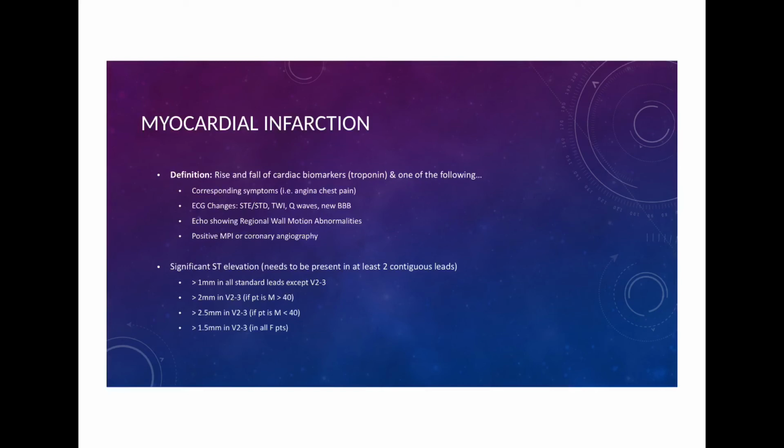Moving on to recognizing patterns of myocardial infarction. This is another common reason that we get ECGs in our patients, especially those who present with chest pain. And many times we'll see things that look like ST elevations, but we're not sure whether they're concerning enough to call cardiology or start the patient on medication specifically for a myocardial infarction.